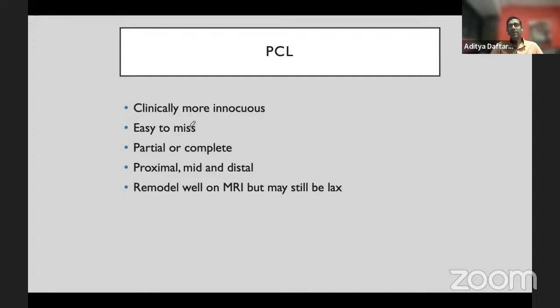So anytime you have a patient who you say, patient had an injury 6 months ago, I'm pretty sure there's PCL laxity, and you, the idiot radiologist, keep saying the PCL looks normal, realize that for us, the tissue may have remodeled well, and it's very difficult for us to tell that the PCL is torn or abnormal in those cases. And for you to demonstrate that there's laxity, you're best off probably doing a posterior tibial stress radiograph compared to the opposite, showing you that the tibia is actually translating posteriorly.